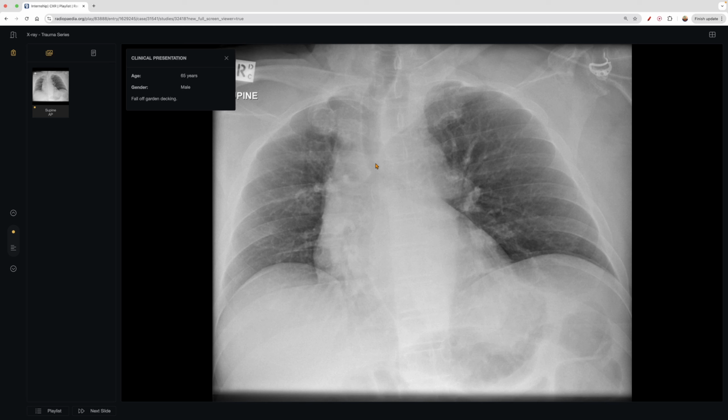Sometimes you can look at the trachea. It's not really reliable because some pathologies actually skew the trachea to different sides. Anything that can cause increased pressure or mass effect. So a pleural effusion, pneumothorax can push it, atelectasis would pull it. So just keep that in mind. Not the best utility for that.